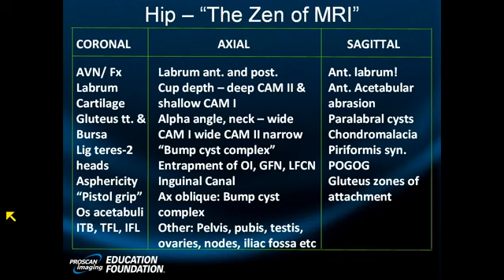I like 2s, 3s, and I like radial 1s. Let's roll. I'm quite interested in this, which looks suspicious for what I described for you earlier, a roof abrasion.